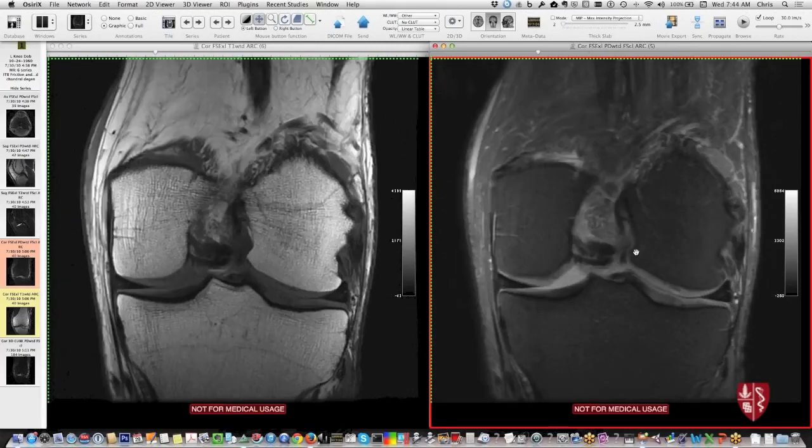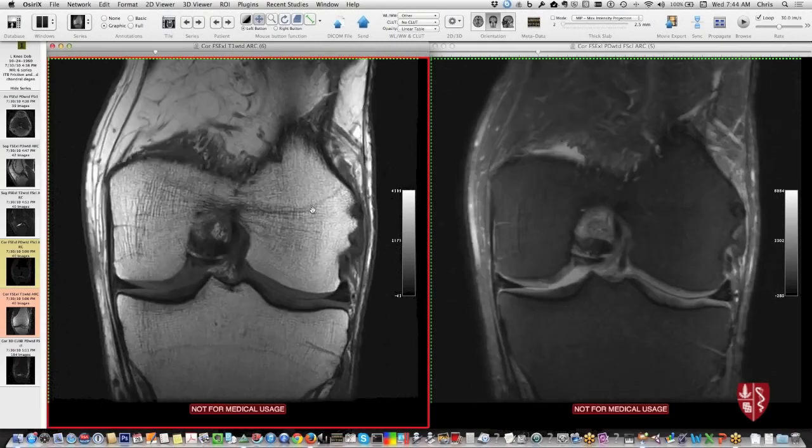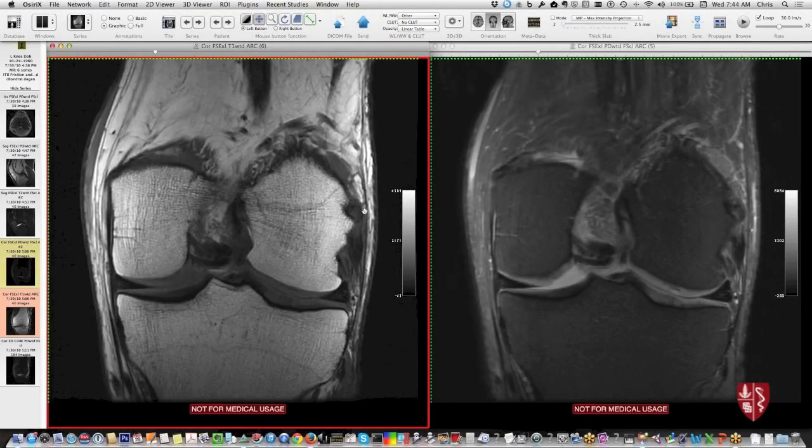All right, and then we're going to go over to the lateral collateral ligament complex. The fibular collateral actually comes off of this irregularity on the lateral femoral condyle here. So I've often likened this to a face. I call it the cameo sign, and if you imagine a person's face facing to the right here on the screen, this would be the eye, the nose, and the mouth, and this is the neckline. The convenience of that is that the fibular collateral comes right off the face. It's like that scene out of Alien or something like that.